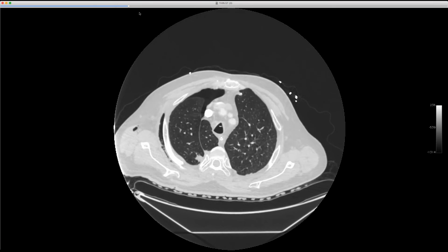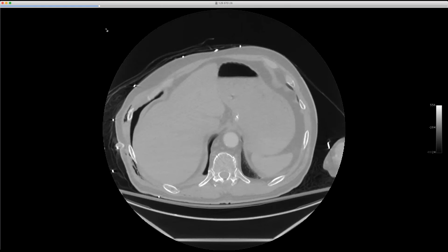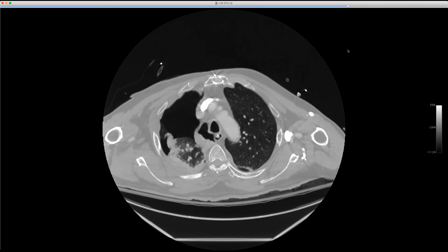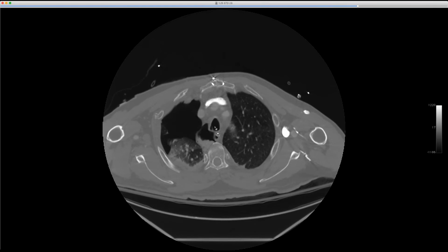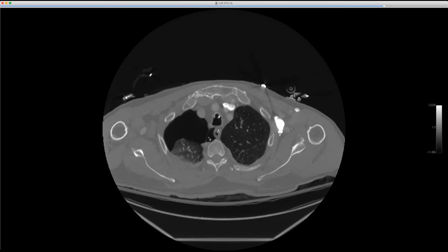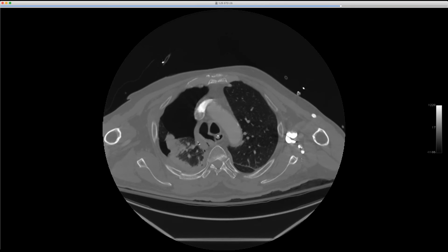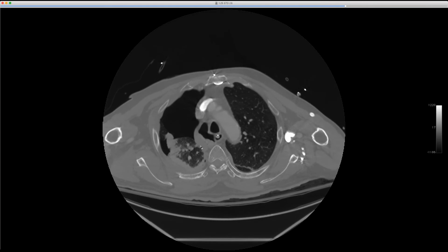So you're saying that the azygous vein had been outside, and went back in? And went back in. This is after. I don't know if it came all the way out, but it definitely pulled away from the lung. So here's your collapsed upper lobe, pneumothorax. There's the mesoazygous going right there. And see the vein sitting on top, like the case I showed last week where it sat on top and then moved away. In this case, you see it just goes right into the posterior mediastinum here. In this case, it popped back in.